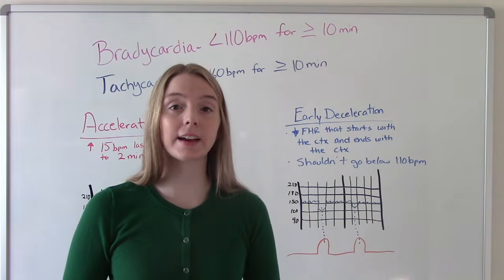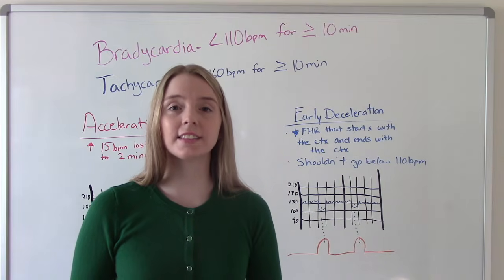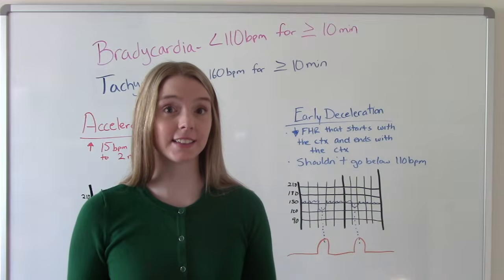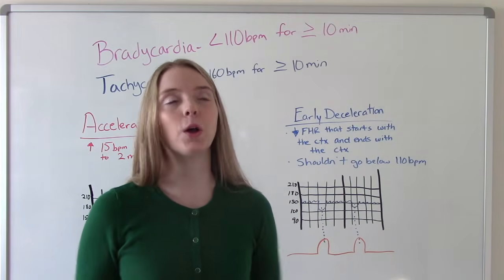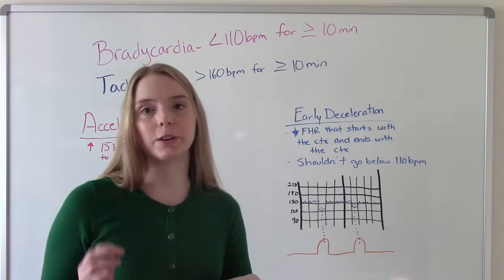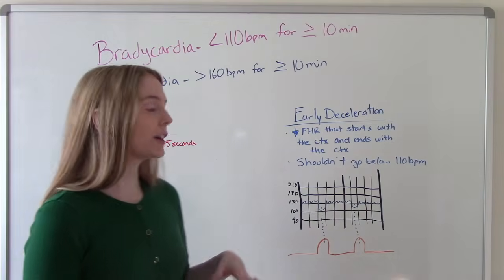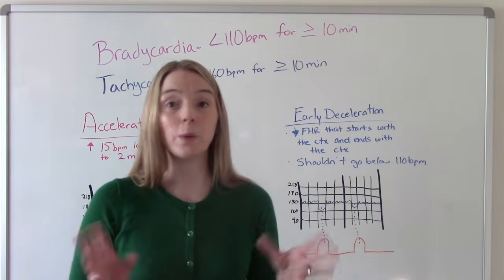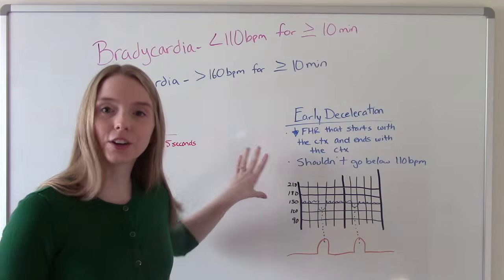So when do we expect to see early decelerations? In the transition phase and the second stage, which is the pushing stage of labor. So they make sense. We like earlies. Earlies are totally fine. We expect them. We're watching the monitor and we know mom's getting kind of close. Maybe we just checked her a little bit ago and she was like 8 centimeters or something like that. And you're watching the monitor and you start seeing her throw these earlies. That's a sign like, oh, maybe baby's head is down. Maybe she's ready to start pushing. So we like earlies. Earlies are okay.